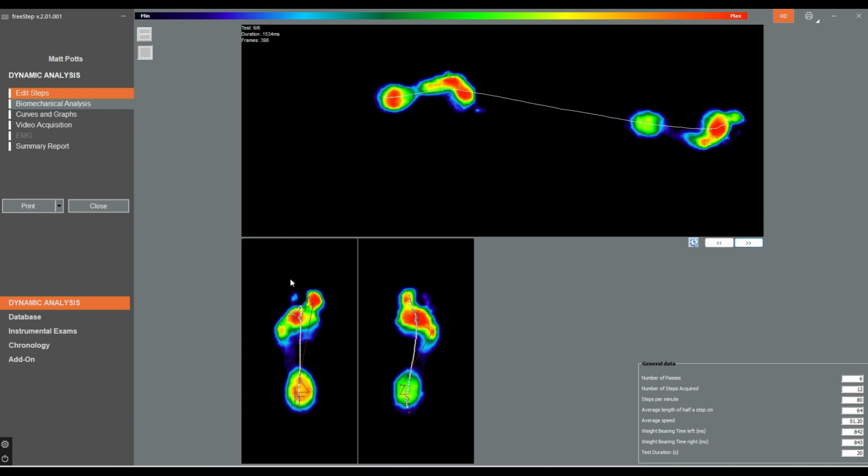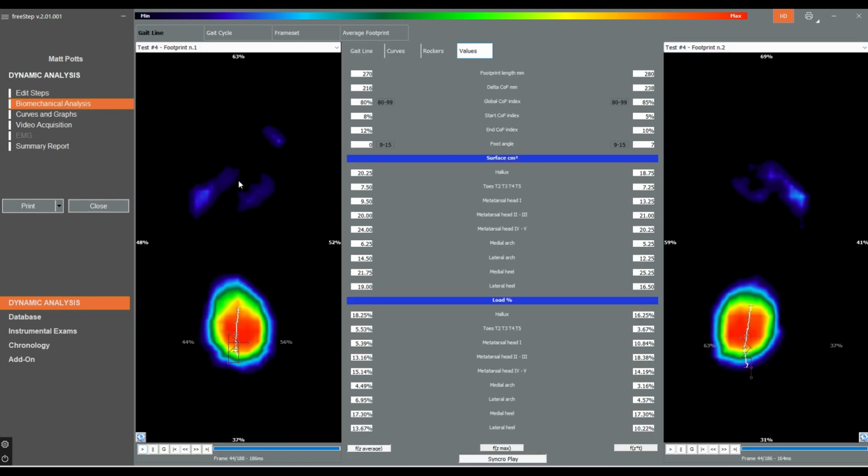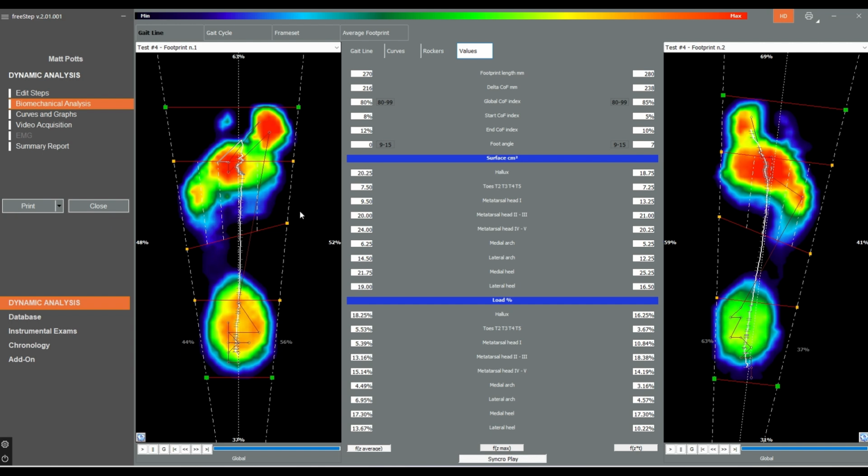So assuming you've picked your two footprints, the next thing you will look at is, well, actually it will usually come up on this picture. So the first two things that I do is click this little cog here, and first of all click the foot frame. That shows the alignment, so it's the flow of how that person's standing. And then I tend to have the speed at about 200.